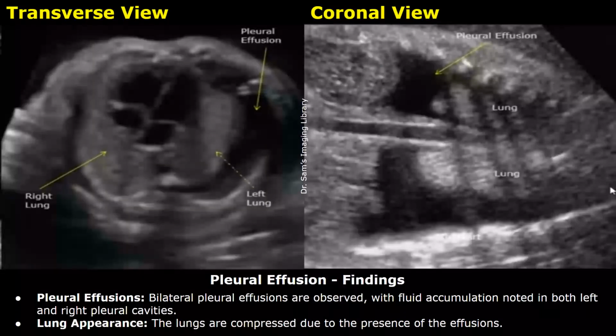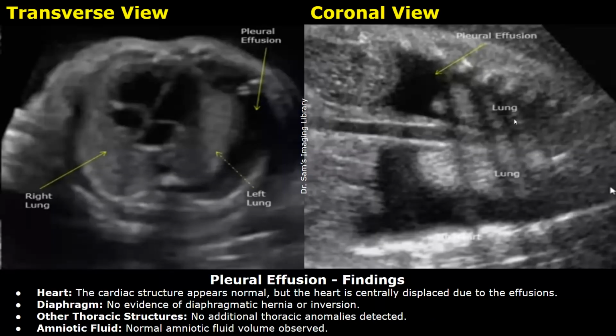Now we have a case of pleural effusion. Findings: bilateral pleural effusions are observed, with fluid accumulation noted in both left and right pleural cavities. The lungs are compressed due to the presence of the effusions. The cardiac structure appears normal, but the heart is centrally displaced due to the effusions. No evidence of diaphragmatic hernia or inversion. No other abnormalities were found.